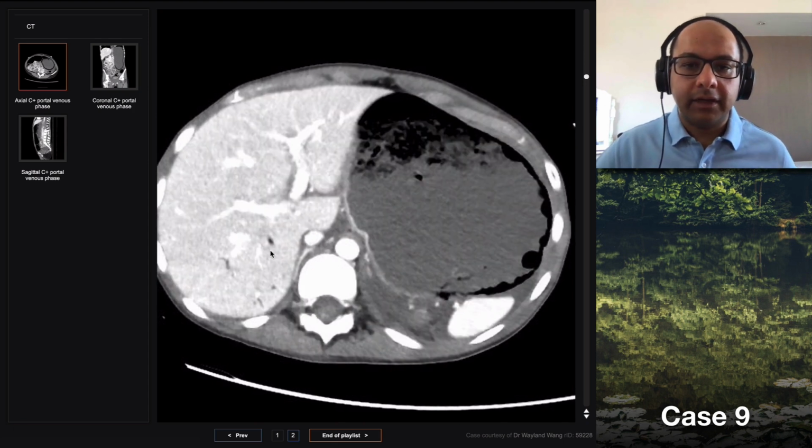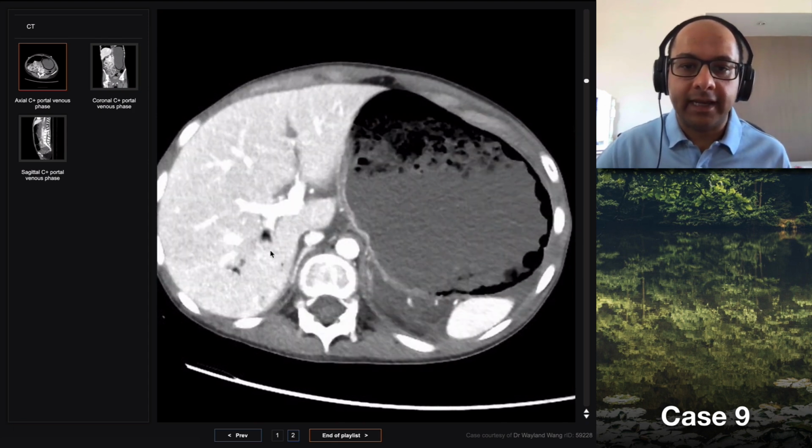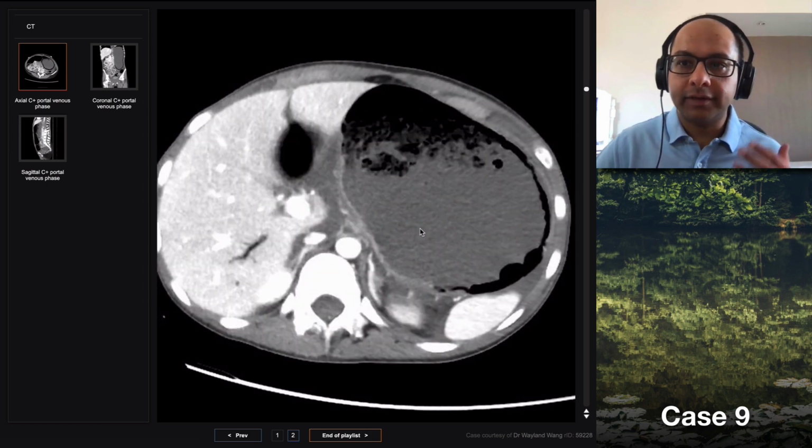So the stomach is actually quite resilient and does not undergo ischemia very easily because there's such a rich blood supply from many different routes into the stomach. However, when it becomes very, very grossly acutely distended, the stretching of the stomach wall can lead to ischemia, as has happened in this case. It becomes atonic. It's not able to get rid of the food into the small bowel.